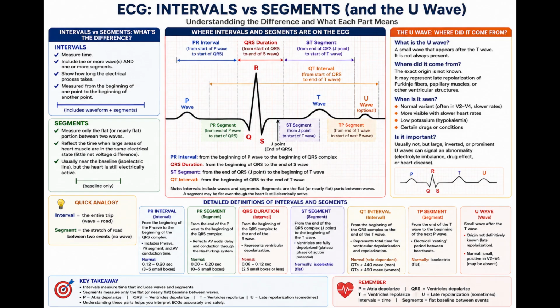The ST segment and J point. The point where the QRS complex ends is called the J point. The ST segment begins at the J point and ends at the beginning of the T wave. During this period, the ventricular muscle cells are largely and relatively uniformly depolarized. Because there is little net electrical difference between ventricular regions, the ST segment normally remains close to the baseline. The ST segment corresponds to the plateau phase of the ventricular action potential. Elevation or depression of the ST segment can be clinically significant, but it must be interpreted in several leads and in the context of the patient's symptoms and condition.